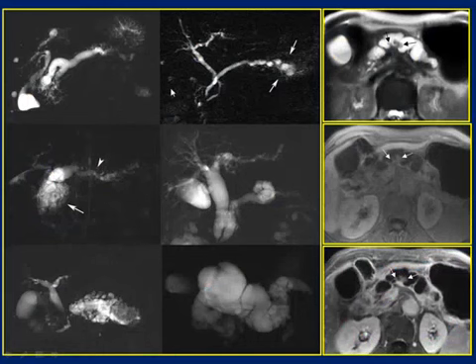Here we have a series of examples of IPMN involving the main pancreatic duct. You see this feature of sharp margin. In general, the main pancreatic duct has sharp margin, and this is one of the differential criteria with the dilation we see in chronic pancreatitis. The involvement may be complete, as in this case, or partial, as in this case, where the major involvement is in the body and tail of the pancreas.